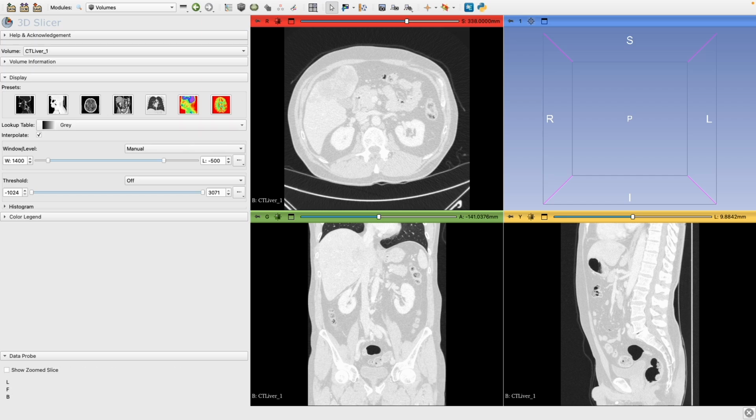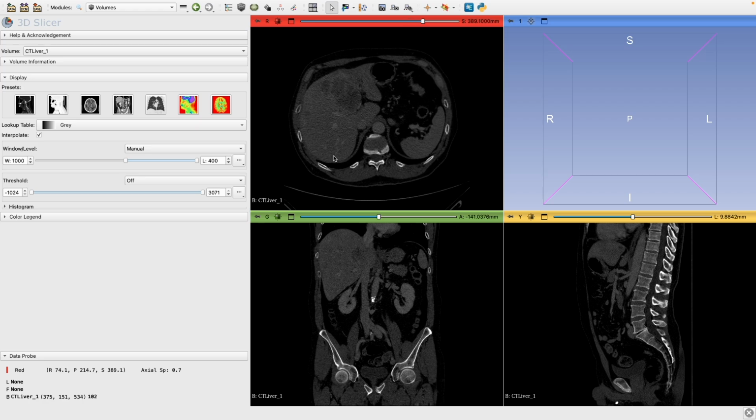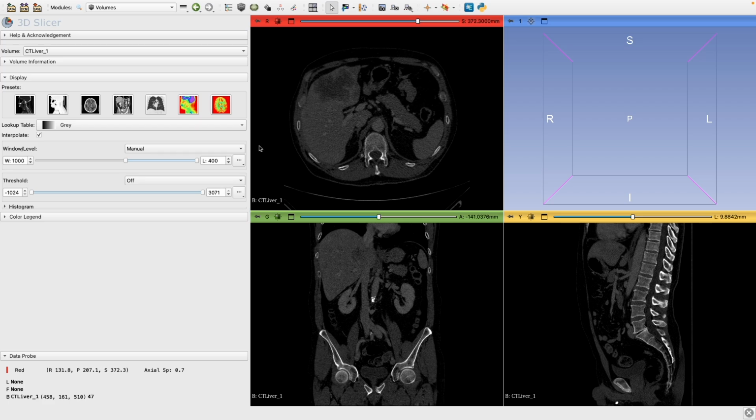So if you hover over them, they'll tell you, so this would be CT bone. If we wanted to take a look at the bone, look how the bone pops out nice and easily there when we're taking a look at this. All right. Now if we hover over this area, I believe this is air, so we don't really want to look at that here. This is going to be a brain preset. So CT brain is going to look at brain tissue, which of course we're not as interested in.